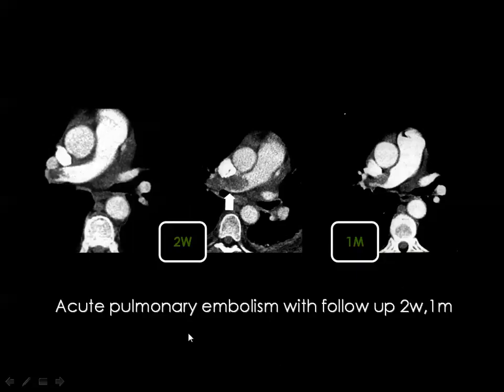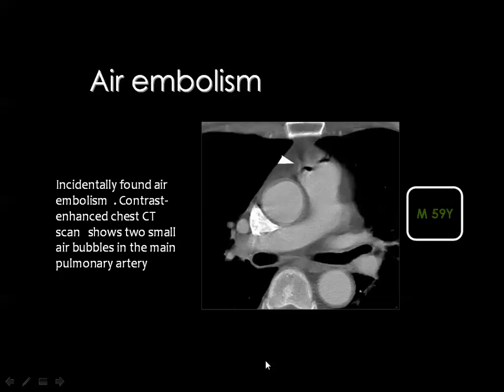Then you would expect that the initial scan of pulmonary embolism will show the embolus in one of the vessels, and it is expected after some time, let us say the range of 10 days for example, that you may feel that the embolus will increase in size because of the aggregation of the blood behind the true embolus. And whenever the embolus is chronic, it will have an eccentric location in the vessel with the patency of some of the vessel lumen.